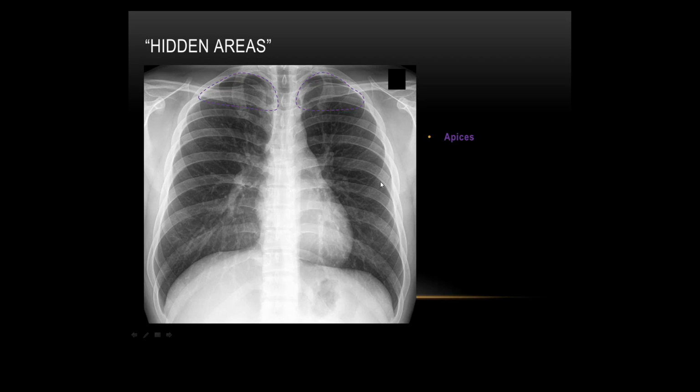Yeah, online they said hilar. Excellent. Retrocardiac. Excellent. Diaphragm. Excellent. So hilar. Going back to what I said earlier on, density, position, and size. Look at them every single time and look at that hilar angle. If you lose this hilar angle on a normal, good chest X-ray, where it's nice and straight, you've got to be thinking, is there something going on there?